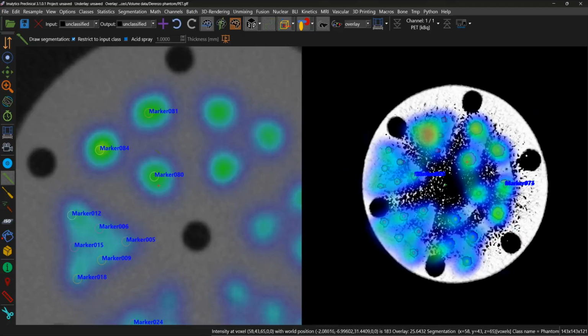So that comes up with 3. We repeat this for the 3 planes, right? So that's the second plane, and then there's a third plane further. The averaged percent recovery is the averaged percent recovery for each line profile per group of all planes. So what that means is if we have 3 line profiles in this plane, and then 3 line profiles in the next plane, and then 3 line profiles in the next plane, that's a total of 9 line profiles from which the average percent recovery is then reported as the percent recovery for this grouping.